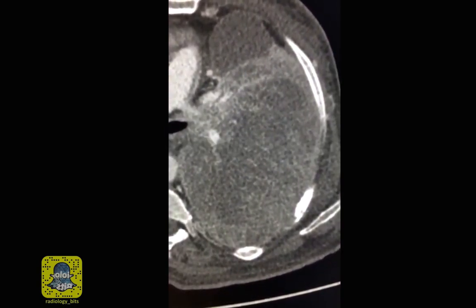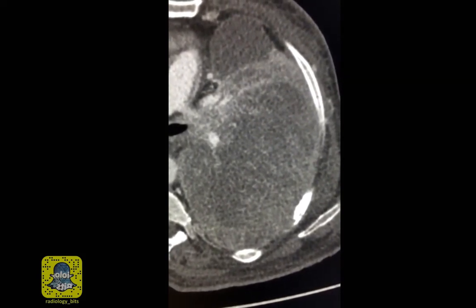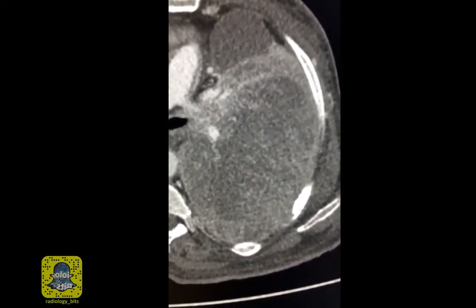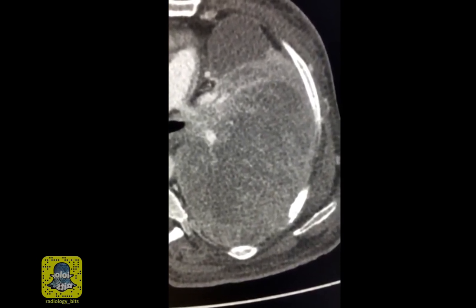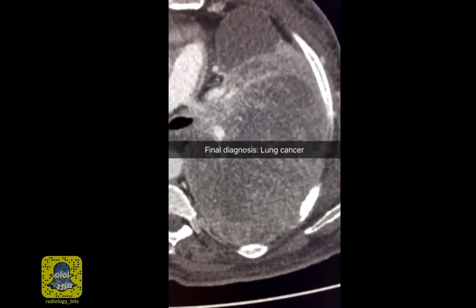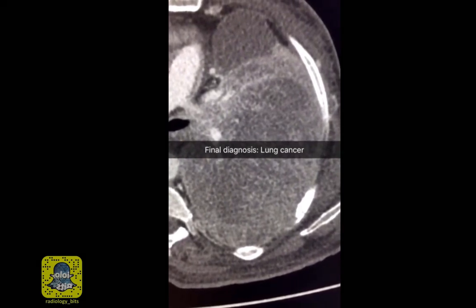It still would be reasonable if you mention fibrous tumor of the pleura or sarcoma in your differential diagnosis. However, start with what's common. Especially if you know that this is a patient who is a smoker, or if you see emphysematous changes, you have to say that you'd favor lung cancer. And this was a pathology-proven lung carcinoma.